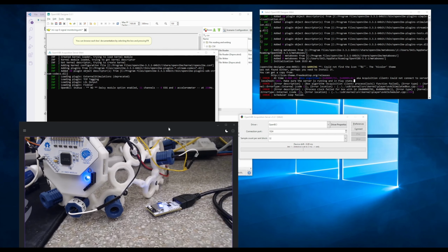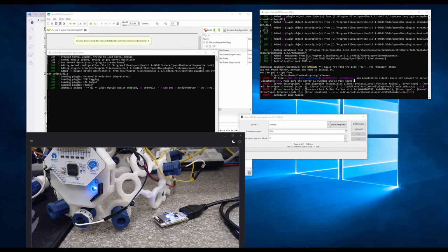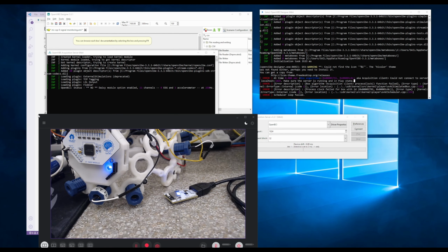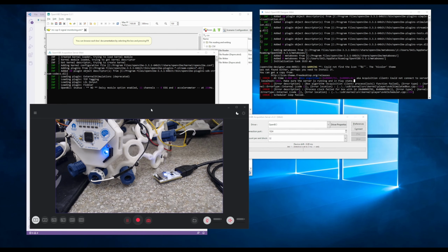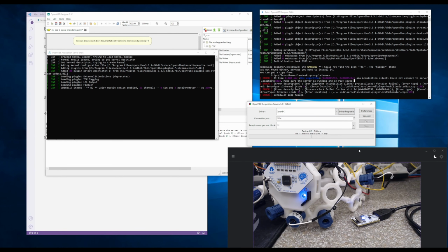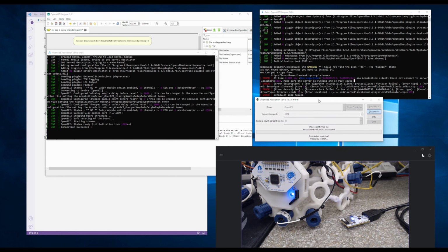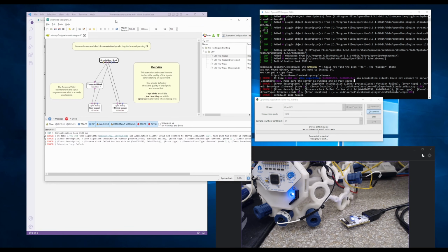Oh, by the way, let me just have this here as well, because one way to know it is streaming is to see the red light go on. So just make this smaller. Does it? Oh. Okay, that's strange. This connection, so you see the red light. That means it's streaming, but it's just not sending the. This means the headset is sending signals, so it's just the server not sending them to the designer here.